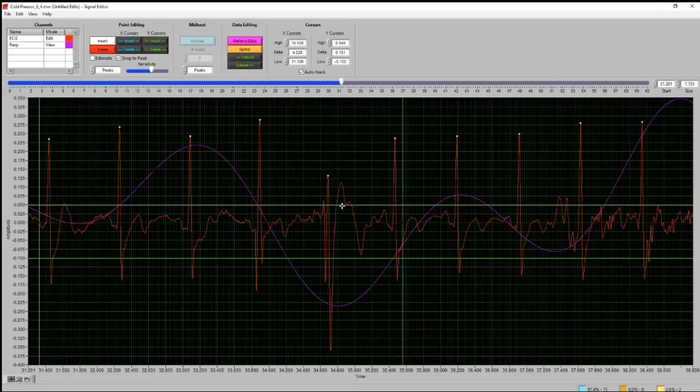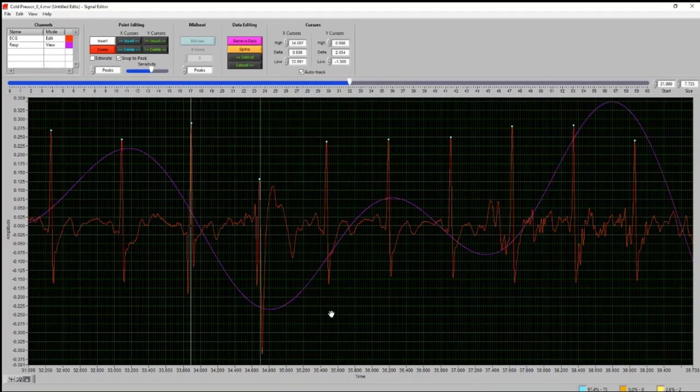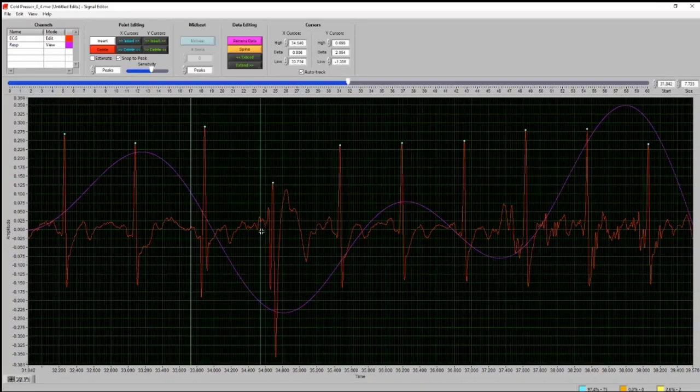Now, if this is just a motion artifact, which it looks like it is, but we can still see that peak there, the QRS is intact and looks good, we could even use our relevant timing to ensure. In this case, there's nothing else that looks like that, but just to show you, there's multiple things we can do to get an idea of where that should be placed. If all of that fails, that's when we would implement that sort of midbeat procedure, because we're just not 100% sure which one it is. And those are the cases in which it would count towards the 10%.